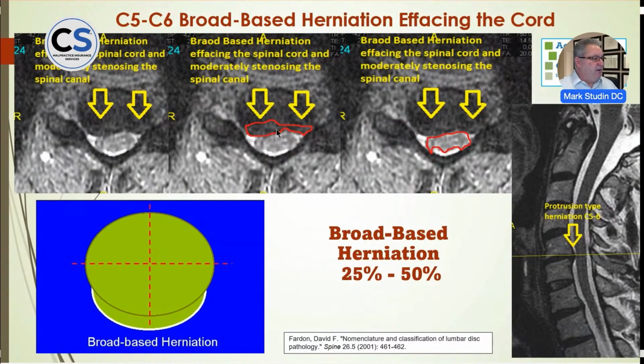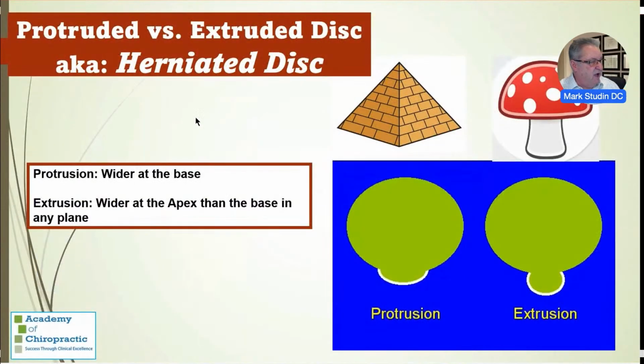This is a bilobular herniation in a broad-based scenario. And you see how crazy jagged it is? It's not like a perfect ellipse. This is a sack of jello going in every different direction. So here's what it looks like here, but here's what it looks like here. And the sagittal will help clearly define what's going on. No one image is going to give you your picture. Everything has to define what's going on.